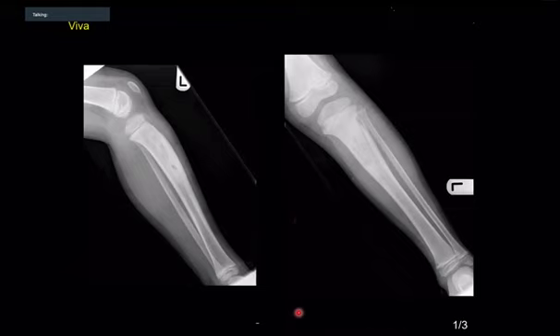Infection. And why do you say that? Because I think it's the way the process works. You make the involucrum, then the sequestrum, and the layering. There's a word which comes to your mind. I want to hear that word. Look at the shape of this. It is like a burrow. If a mouse goes into the ground, what does it do? I totally forgot. It was in my mind. Okay, I'll take over.